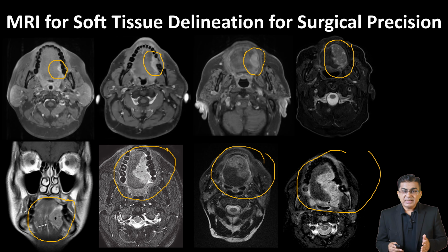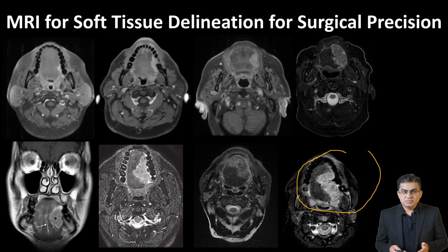This requires a massive resection and a bulky free flap just to prevent aspiration and restore volume. Functional outcome for speech and swallowing will be severely impacted in this patient. Not only will the surgical plan change, radiation plan will also be altered as your GTV and CTV will change accordingly.